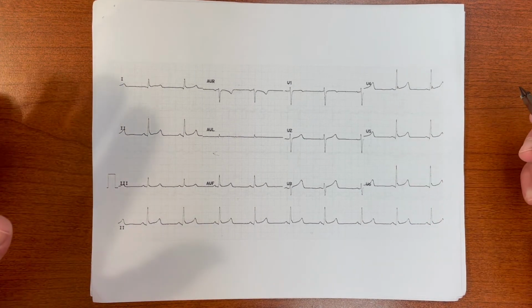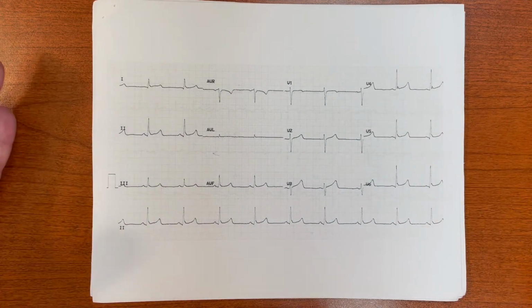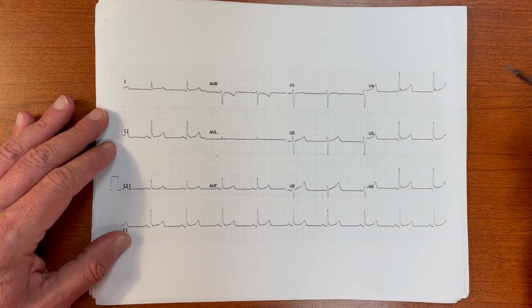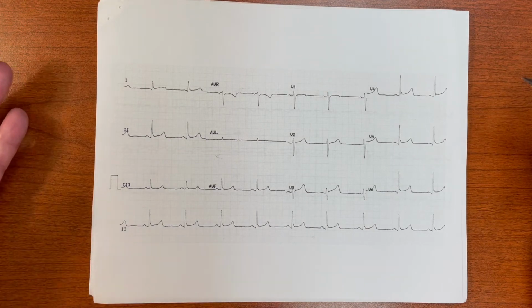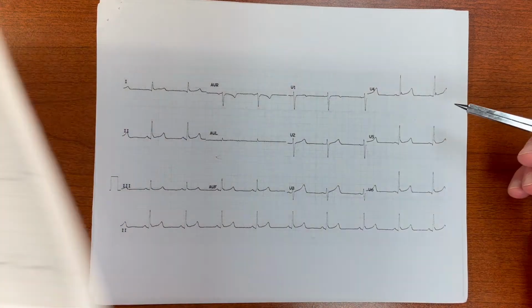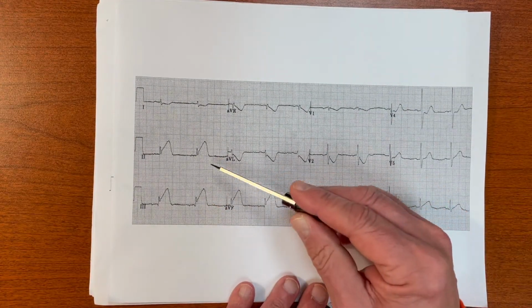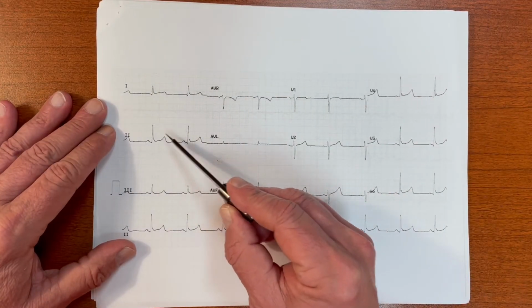So being chest pain, we're going to be looking for ST segment depression, ST segment elevation. We distinctly don't see ST segment depression here. The T waves are all up. So we have to be talking about ST segment elevation to look for. And we distinctly do not see a tombstone, and we don't see it focal, and we don't see anything profound. In fact, all our ST segments are concave.